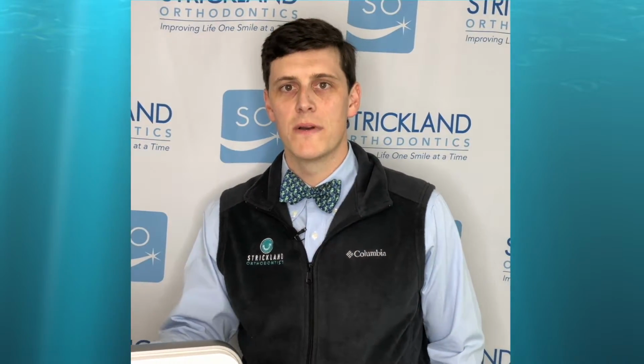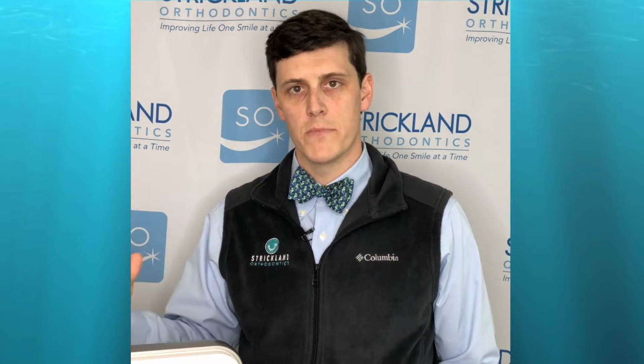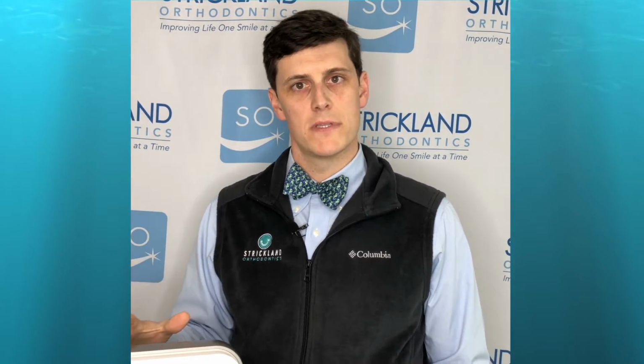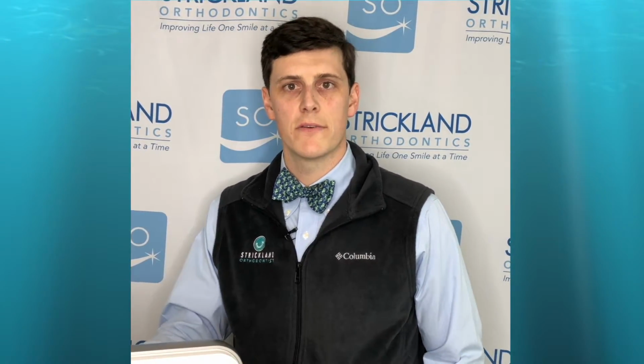As you can see in that quick demonstration, there's a lot of customization that goes into our planning and staging and all the movements that we build into. We actually look at every tooth specifically and really try to customize its final position in harmony with the arch and everything else that we're trying to achieve for the patient.